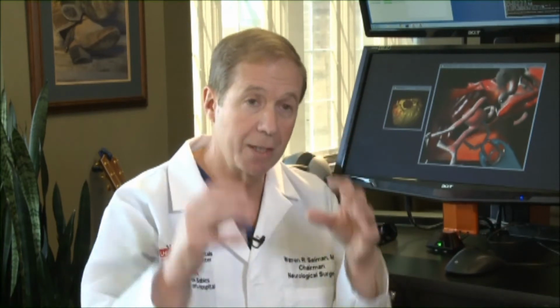We put on special goggles and we're able to see in 3D, just like everyone does at the movies now. So you actually can rehearse and look through the patient's own anatomy. The very thing that I'm going to see tomorrow inside that patient's head is what I can look at on the screen. And not only that, I can manipulate it, I can plan what I'm going to do. So if I'm going to treat an aneurysm or treat a tumor, I know what it looks like, I've seen the approach I'm going to use, I know what's behind it, what to beware of, and it makes me that much more prepared to deal with the surgery.